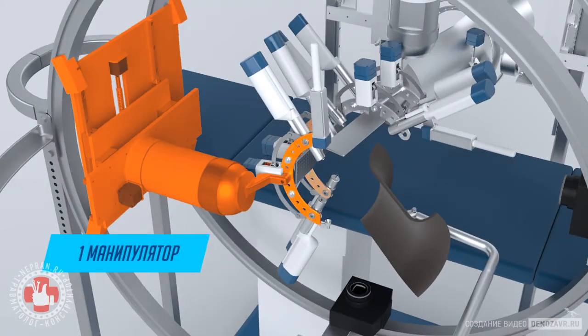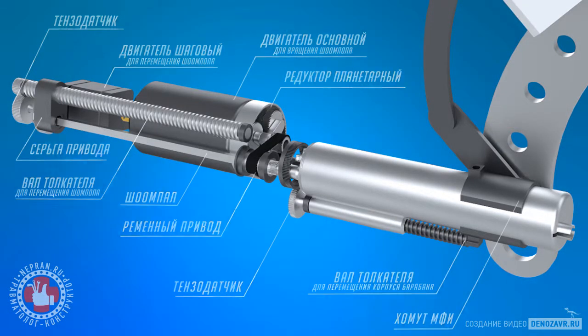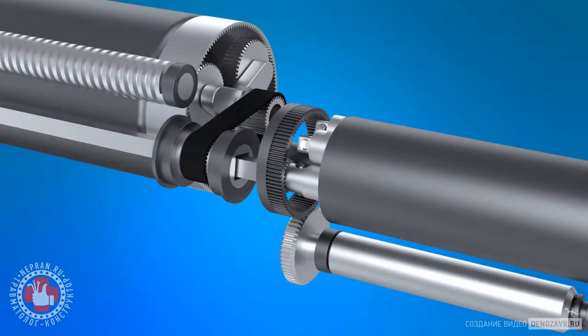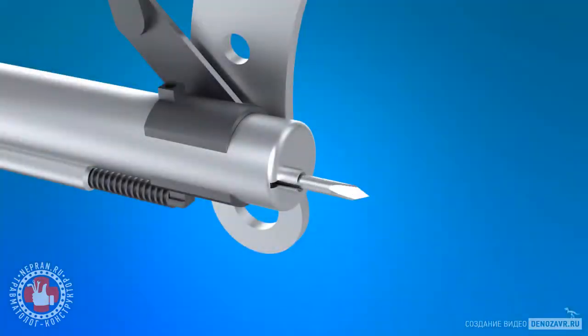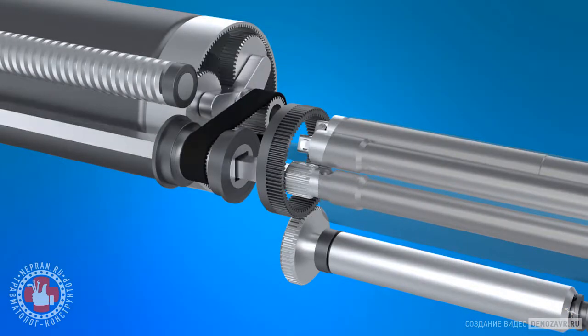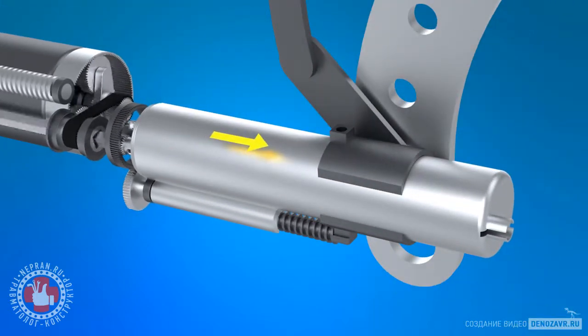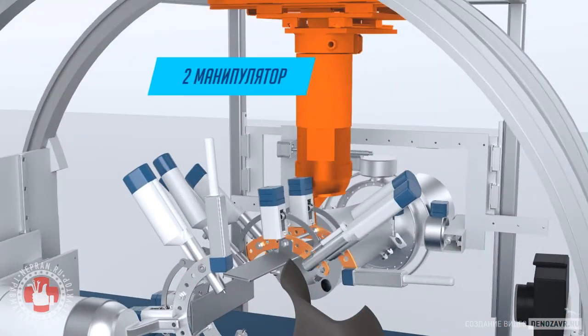The first controls a model with 2 pairs of heads, each of which has 2 engines designed for longitudinal movement of the ramrod, which grabs and extends the tool from the magazine and back, for tool rotation, and for longitudinal movement of the body, in which the spokes, scalpels, drills, and screwdrivers with locking screws are laid, and tool changes by turning the magazine. The second manipulator is the same, for the proximal fragment.